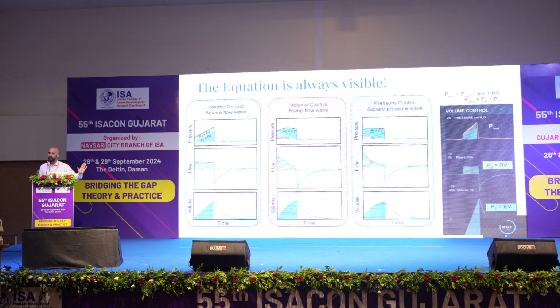So the default ventilator screen you should maintain when you're in practice is actually these three. You don't need to waste screen space with a loop or any other information. What you actually need is a flow time, pressure time and volume time scalar. Three most important graphs because graphically that is the equation of motion.